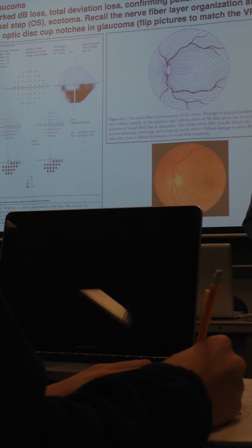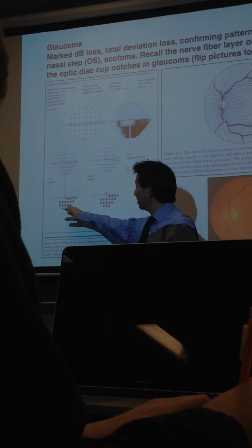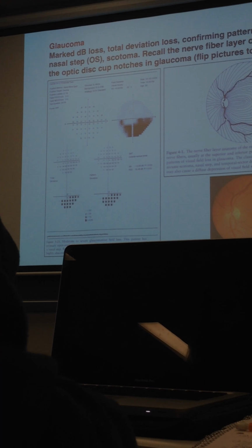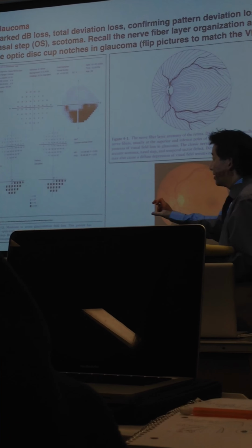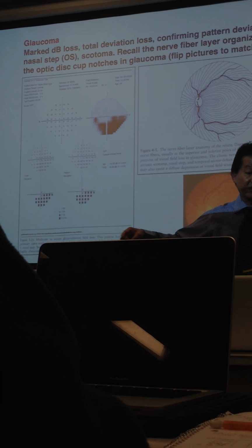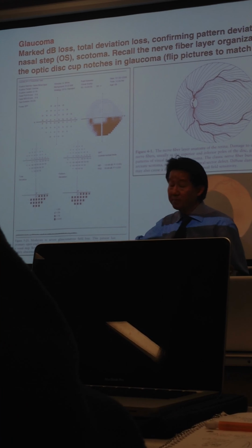So a scotoma, you know, absolutely no function, is late stage glaucoma. So with glaucoma, and we'll get into this with the next PowerPoint, you always get these hemifield losses. So this is exactly the same, right? So the pattern deviation in this case tells you that that is an absolute sharp edge scotoma. Because it doesn't increase like this one. It didn't get smaller like the other one. There's no general loss. All the loss here is from that one pathology, because this is exactly the same.